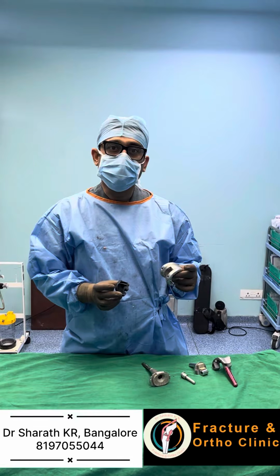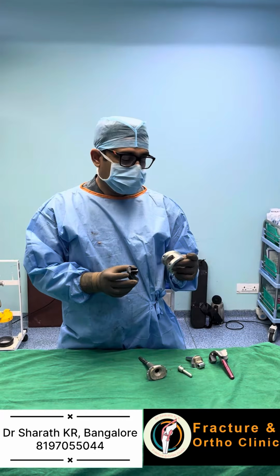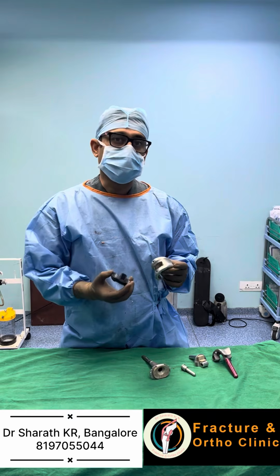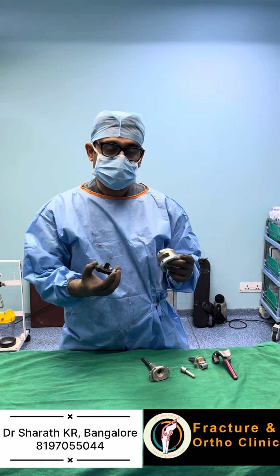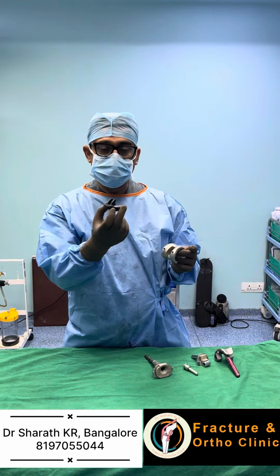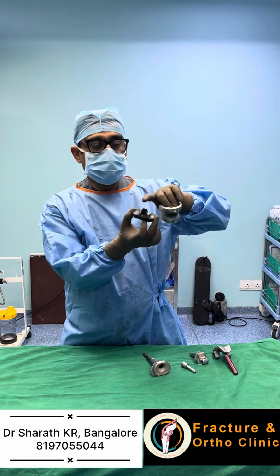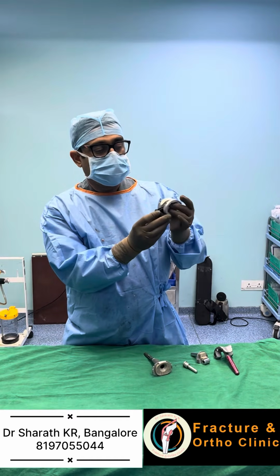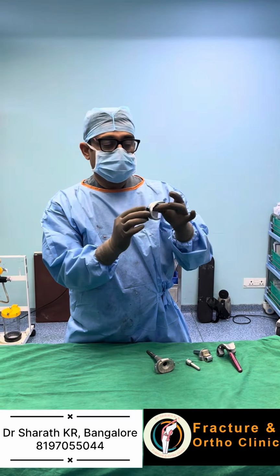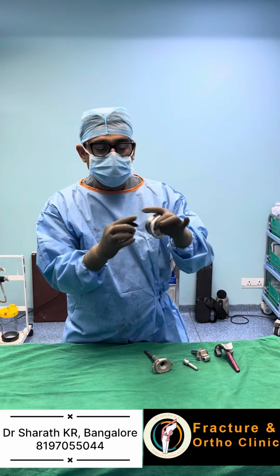I am explaining the hinge knee replacement because this type of question is asked by many people nowadays when they come to discuss regarding the knee replacement and types of knee replacement and revision of the knee replacement surgeries. You can see that this implant, this is a femoral component and this is an insert, this is a box here, this is a cam and this is a post. This post and when this cam sits here, whereas this and this implants are totally separate. Totally separate. So this is separate piece, this is separate piece. There is no link between this and this.